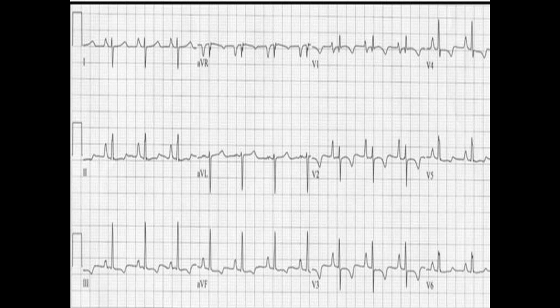What about ventricular hypertrophies? We don't have left ventricular hypertrophy. We don't have any of the complexes that meet those criteria. Right ventricular hypertrophy we do have. Look at V1. V1 is more positive than it is negative. So we're going to call right ventricular hypertrophy, and then that rules out our left posterior hemiblock, so we're just going to document it as right ventricular hypertrophy.